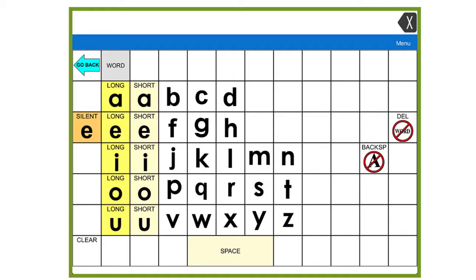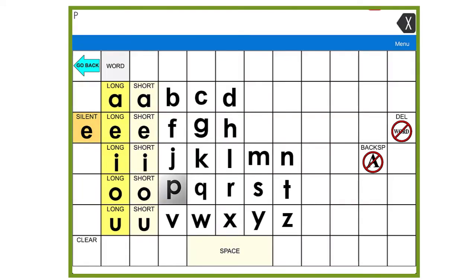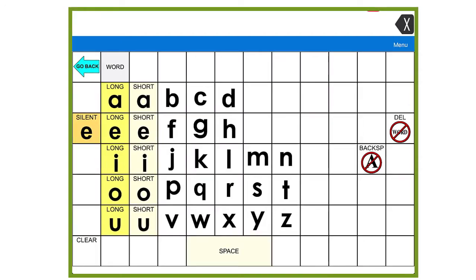Let's take a look at how we could use the phonics page. You'll notice the individual sounds are recorded using digitized or recorded speech. That's what allows us to manipulate the individual sounds to make new words. Pa. A. T. Pat. K. A. T. Cat.